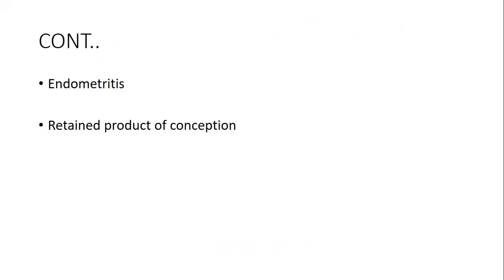Retained product of conception is one of the indications for a patient post-cesarean section. Our job is to give the appropriate findings in the results that we may find. Echogenic contents within the endometrial cavity may suggest retained product of conception, but again, you also need to quantify.